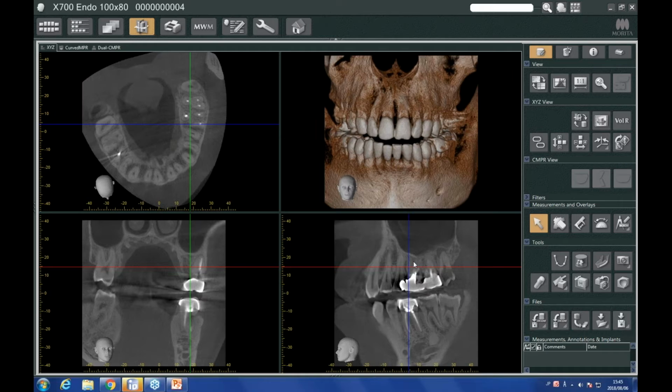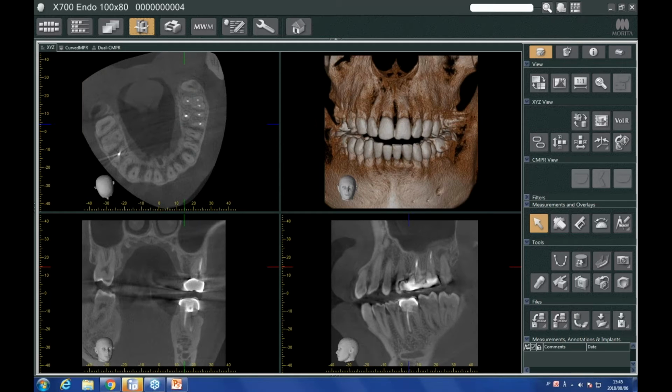Again, this is just my quick initial overview. Now, as I'm starting to move towards the patient's anterior, I really want to see the detail around where my mouse is hovering. So these lines, of course, I can get out of my way. Up here in the tools, there's a view button and the option to show or hide the positioning cursors. So I'm going to hide those. Now I can still, of course, grab them and manipulate them, but they're just sort of out of my way for the moment while I'm examining this particular patient.